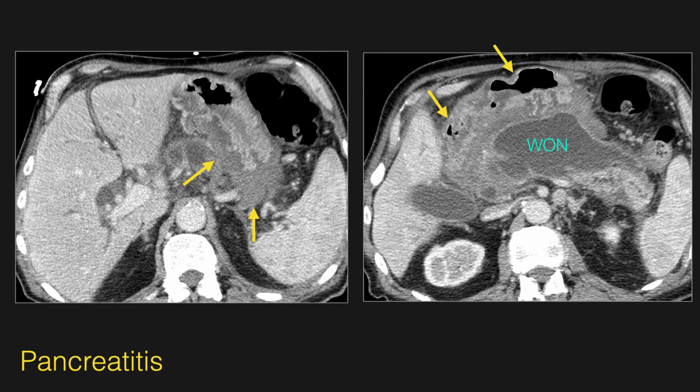And in this case of necrotizing pancreatitis, the stomach is displaced and severely inflamed and thickened as a result of infected walled-off necrosis, with both low attenuation edema and mucosal hyperenhancement. This degree of gastric inflammation as a result of the walled-off necrosis was new and helped to raise suspicion of underlying infection, which was ultimately treated by gastroenterology with cystogastrostomy tube placement.